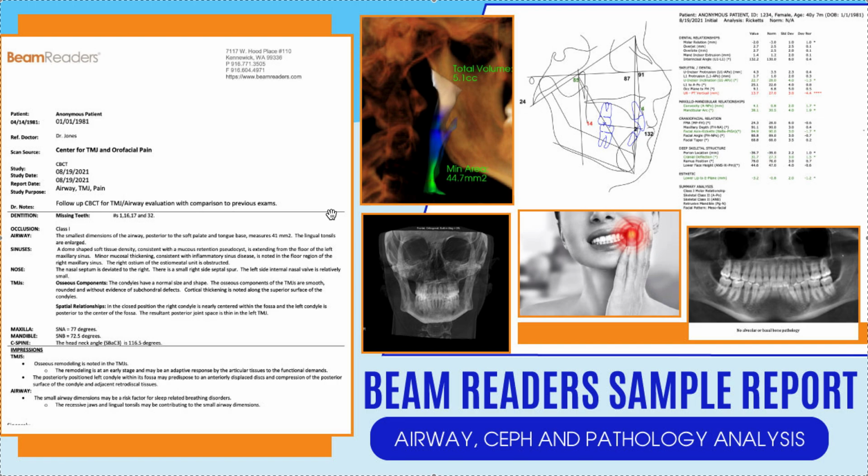So they talked about the smallest dimensions of the airway. The measurement was 41. They also noted that there were lingual tonsils that were enlarged, and that's helpful. They definitely noticed in the sinuses that there was a little pathology, some pseudocyst, inflammatory sinus disease. So that's pretty cool that you can note that. And that's going to affect the airway and the sleep. They noticed in the nose that the nasal septum is deviated.